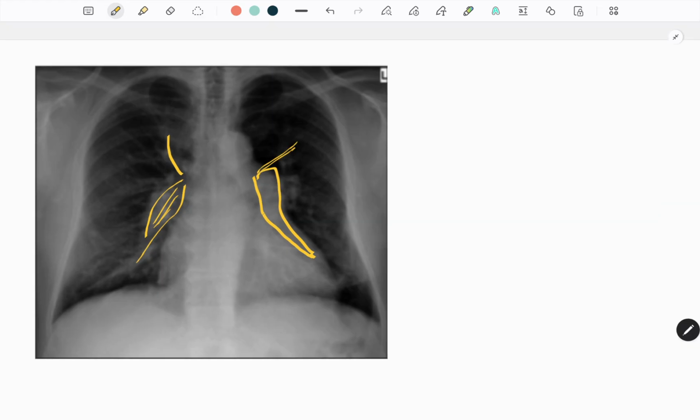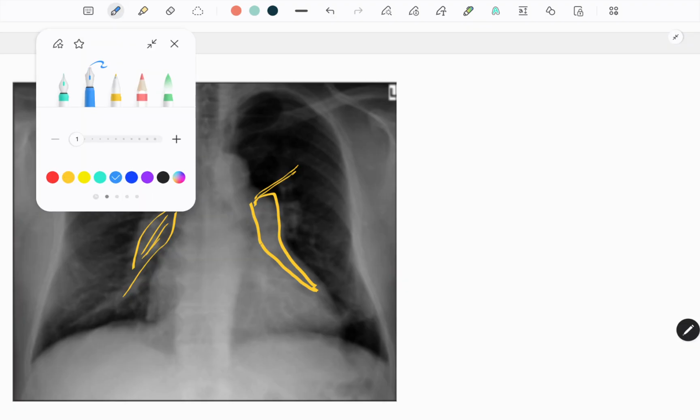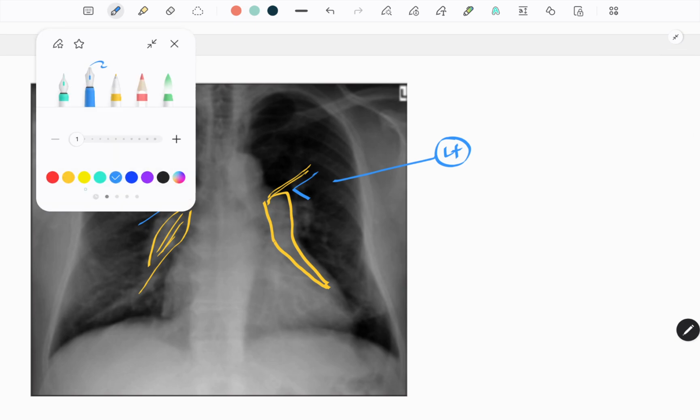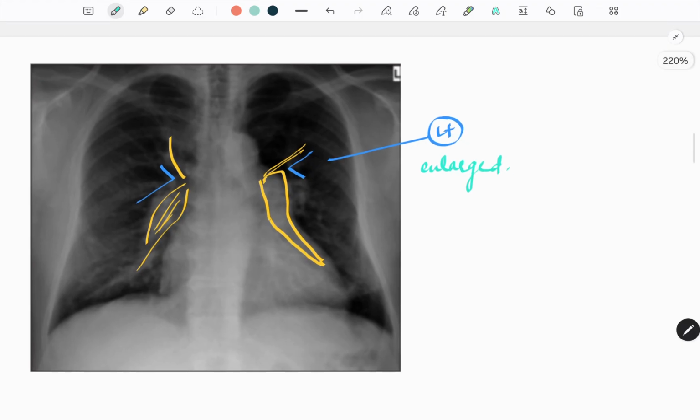And this is the upper lobe vessel. We can see the position of the hilar V point is maintained here. Left one is higher, good enough. But the size of the hilum is enlarged. Next we come to the contour.